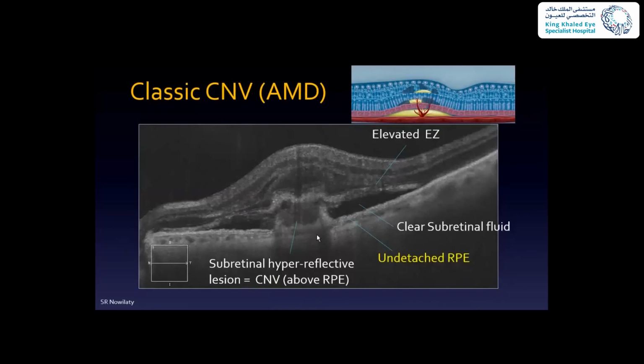Now, as you know, there are several types of choroidal neovascularization. There's the one that grows from the choroid capillaries through the RPE and under the retina. You have the growth of the vessels under the retina, between the RPE and the retina. And here it is. This is what it looks like. Basically, you have tissue going through the RPE under the retina.